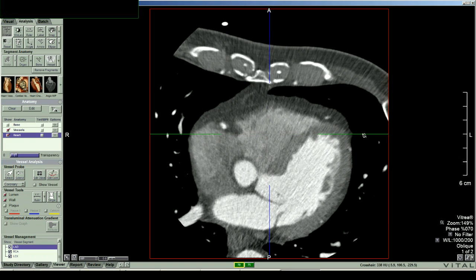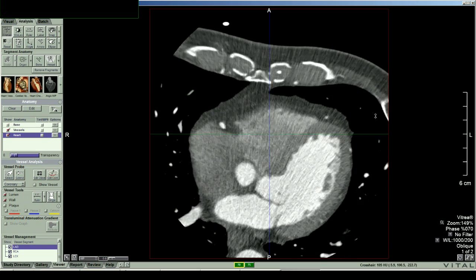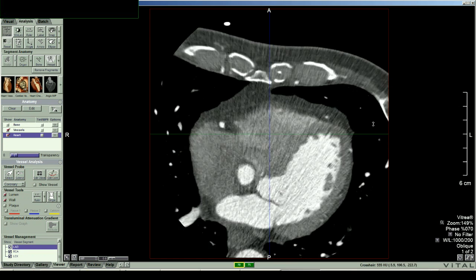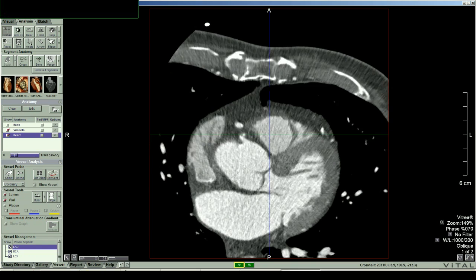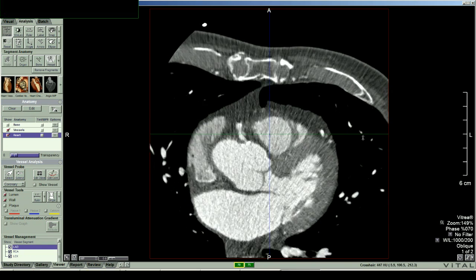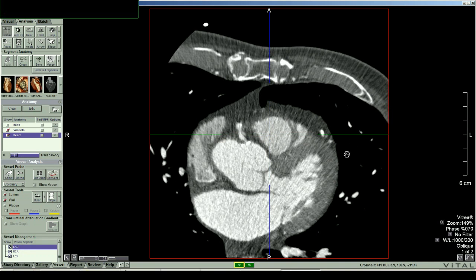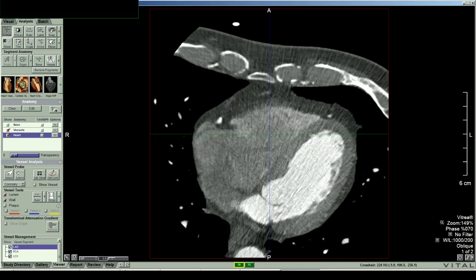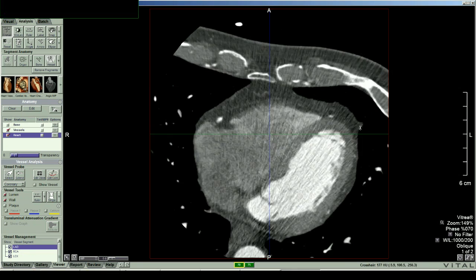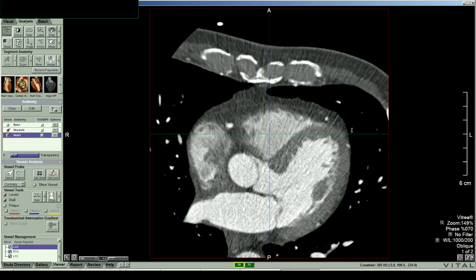It would be subendocardial. And the sequence it goes through is the same as it goes through in the coronaries, where first you get necrotic core or fat, and then that's followed by fibrosis, and then that's followed by calcification. And so I don't see any definite, there's some black in there, but that doesn't look like it. I can't say, that's the only thing I see. I don't see any real linear subendocardial area of fat deposition or scar deposition either. So it doesn't look like it's infarcted.